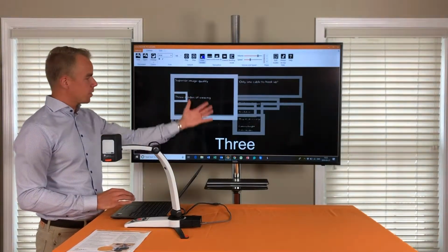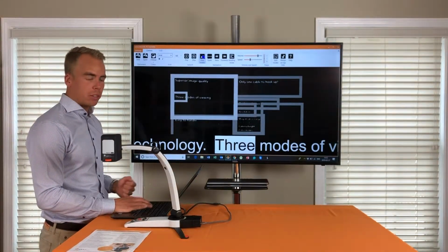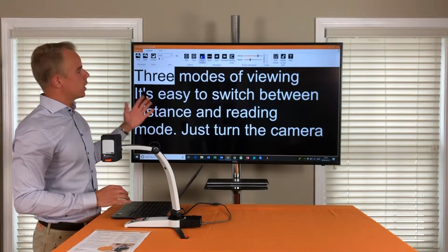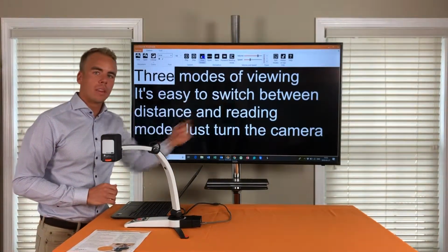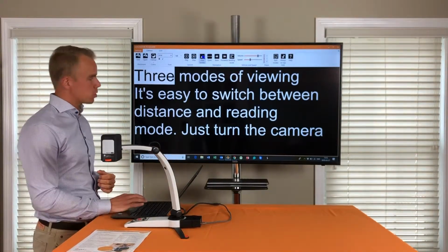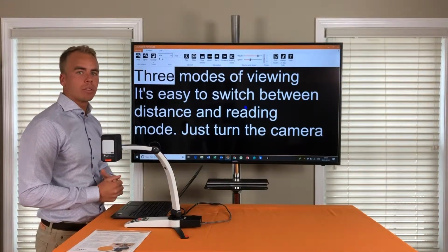Or I can actually have the text and the word below, the text and the sentence below, or just the text. When I'm doing just the text, if I had a touch screen, I can touch on any word in the text and it will start to read from there, or use the mouse cursor and move that on any word, and press, and it will start to read from there.